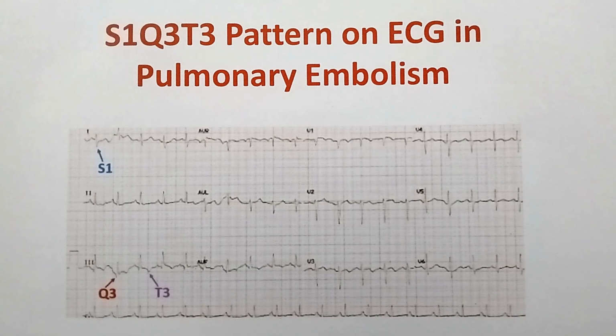But please note that this is not the commonest pattern in pulmonary embolism. This is seen sometimes but not always. Commonest is of course sinus tachycardia. That's seen here also. There is sinus tachycardia here also.